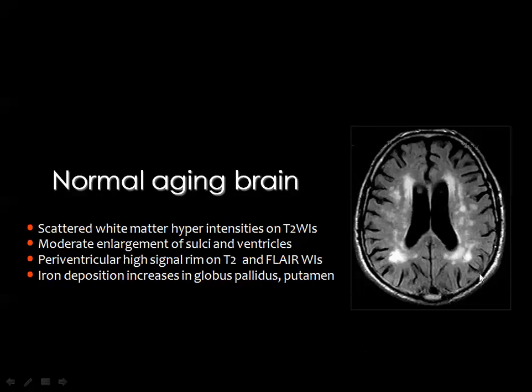And if you look here, this is the FLAIR image, and you see the ventricles are dilated and the cortical sulci are prominent, denoting the presence of involutional brain changes which are accepted for the age of the patient if he is in the 60s or 70s. Then the presence of a rim of high signal intensity framing the ventricular wall is a common finding in old age, together with multiple foci and patches of increased signal intensity in T2 and FLAIR-weighted images.